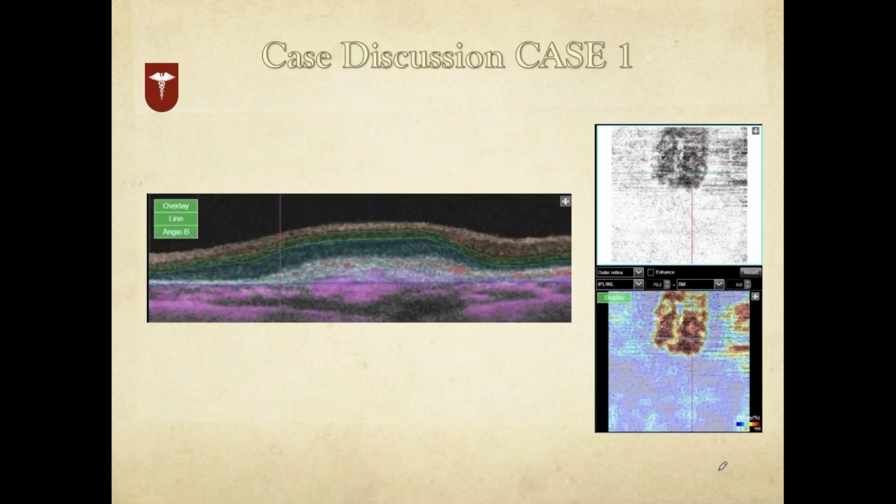right, what I find in this part is there is an active vascular. You see this? The pink layer. This is an OCTA image. You might not be very familiar, but soon this will replace all of the OCTs that you're practicing. So this indicates a blood flow. Pink is the choroidal blood flow. The red is the retinal blood flow.